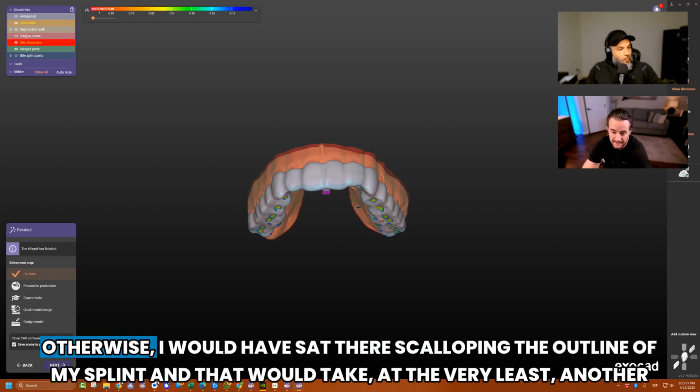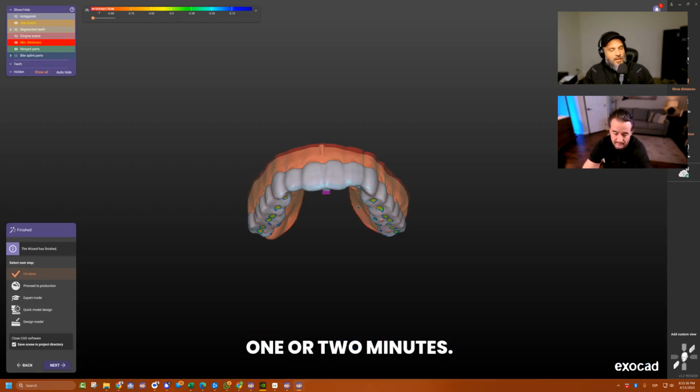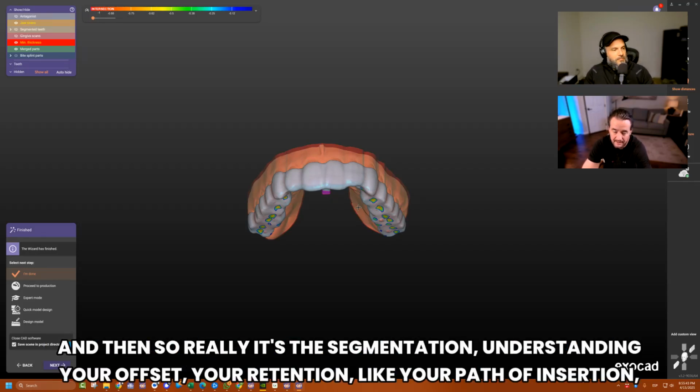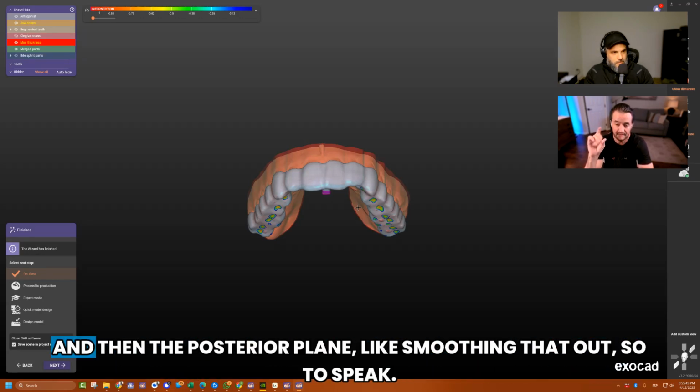Yeah, absolutely. Otherwise, I would have sat there scalloping the outline of my splint, and that would take at the very least another 1 or 2 minutes. But because of the segmentation, the software does that for you and it's ready to go. So really, it's the segmentation, understanding your offset, your retention, like your path of insertion, and then the posterior plane, like smoothing that out, so to speak.